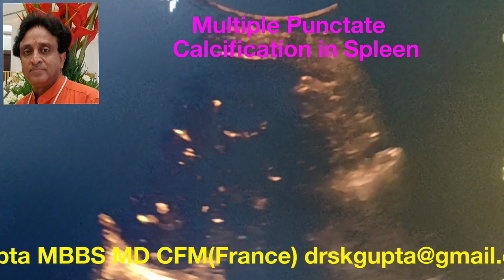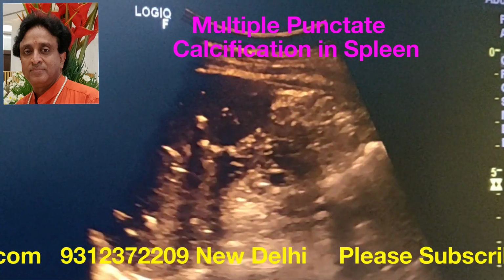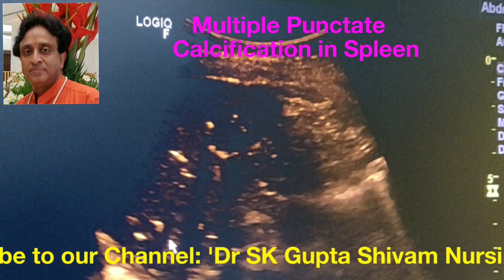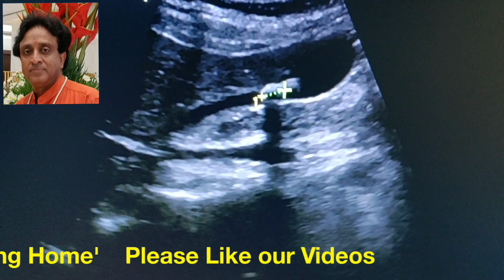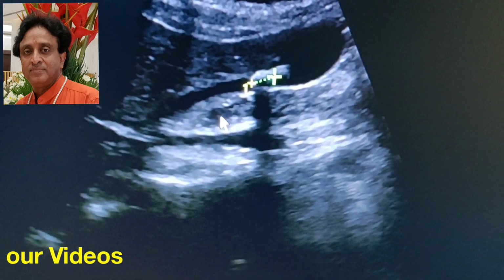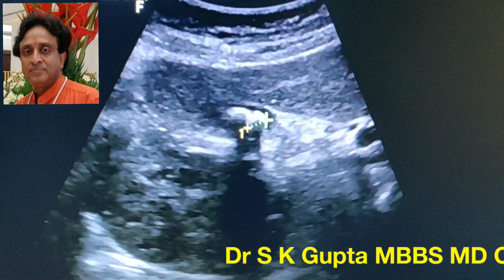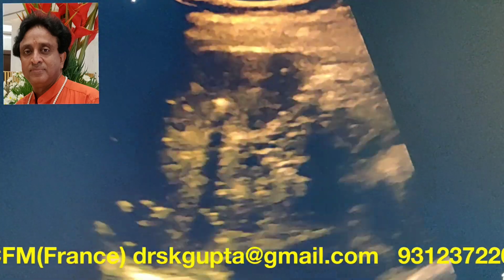histoplasmosis, brucellosis, amyloidosis, the multiple splenic calcifications can be seen all over the spleen, and they are generally 3 to 5 millimeters in diameter, as seen in this case. Incidentally, this patient has multiple calculi in the gallbladder also, and this is an incidental finding, but the main important finding was the splenic calcification, multiple splenic calcification.